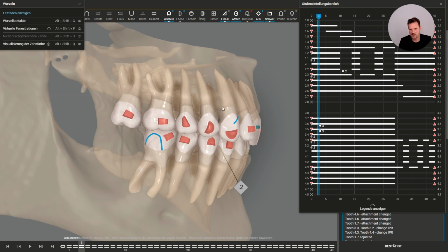You can also see another protocol. So we have an aesthetic start. We have the retrocline pattern protocol for the anteriors. We have a frog staging. So there are different types of protocols. But the first thing that you need to understand is never moving more than 2 teeth at the same time for distalization.